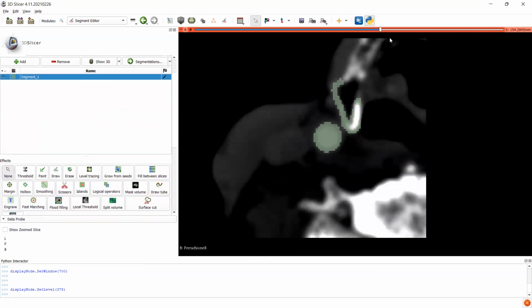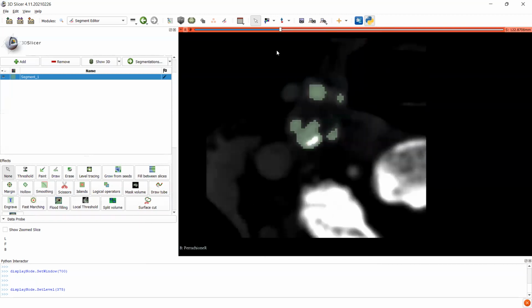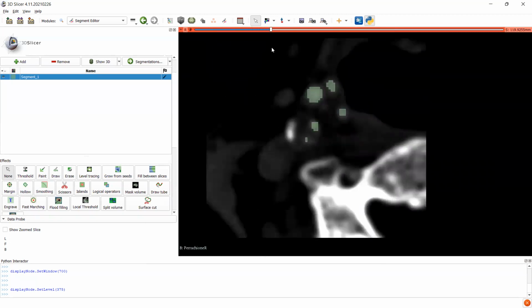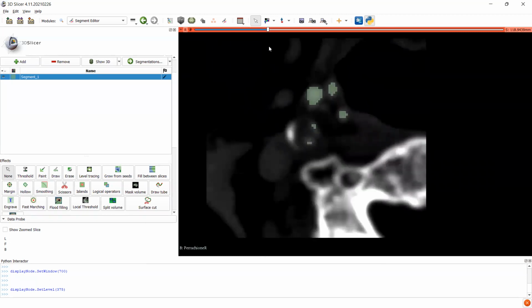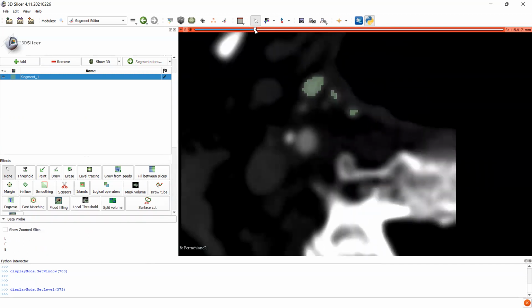And here you're getting less of it at least. And here you can probably erase the rest in 3D view. So you can see right here, it's actually so tight around this area the algorithm doesn't even get through to this side.